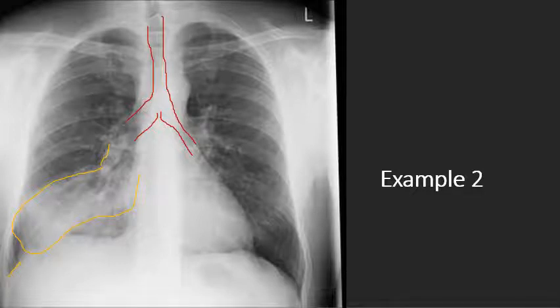One thing that I do want to point out to you is that this patient's x-ray isn't the best. It's very difficult to discern between the lumbar and the thoracic vertebra, and the patient, although not malrotated, it's the exposure that's the problem in this x-ray. So it makes it difficult, but we get the point. The patient has something wrong with them. Moving on to the cardiac, it's less than 2/3. The diaphragm is relatively equal, no air under the diaphragm, and then we have no lines, tubes, or drains.